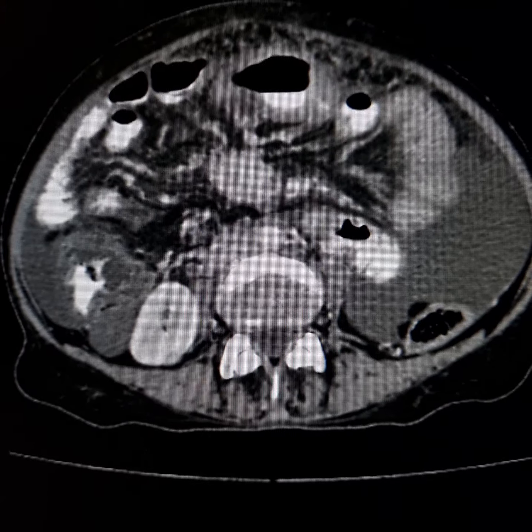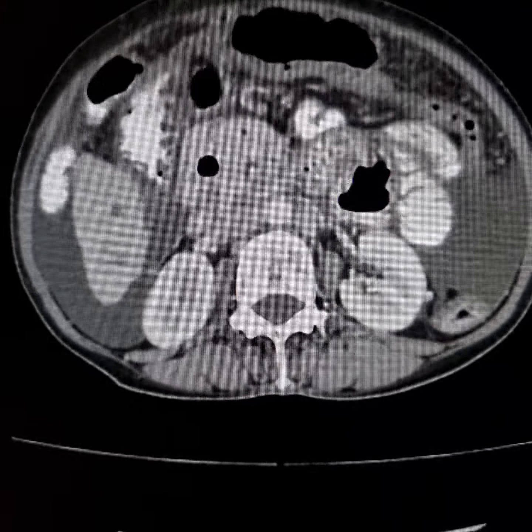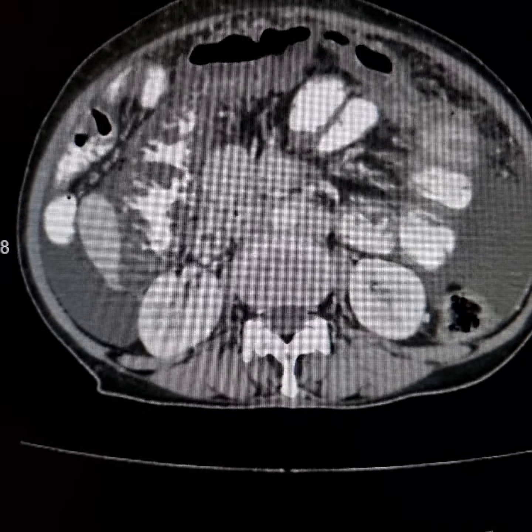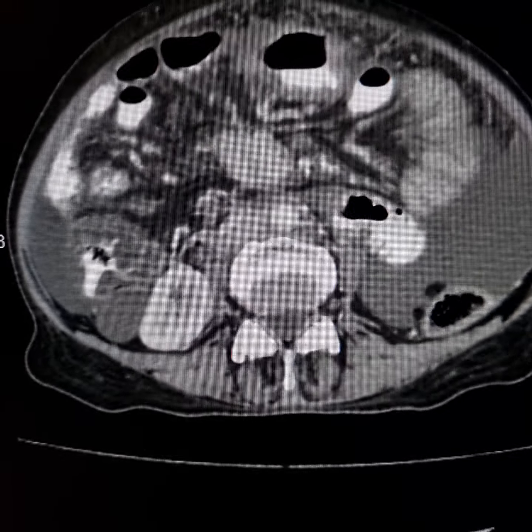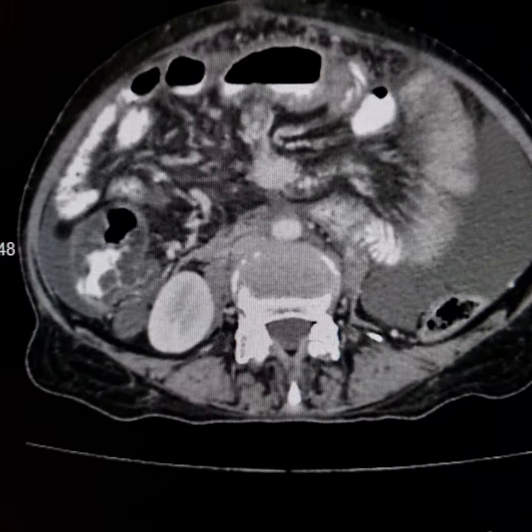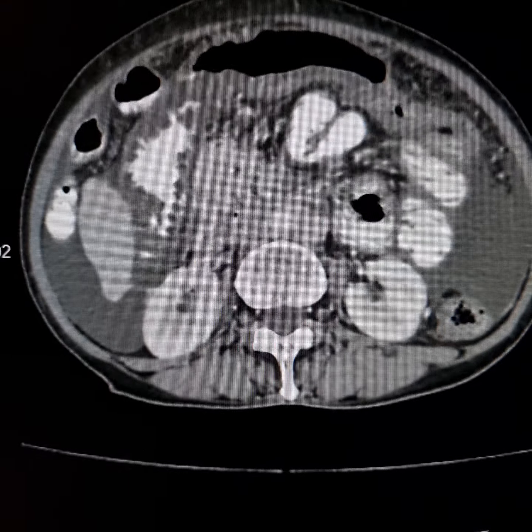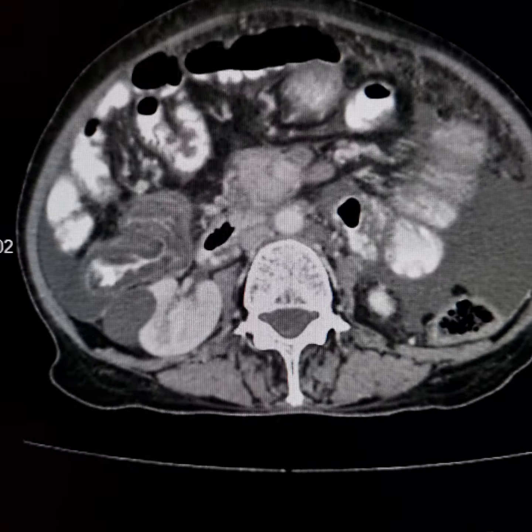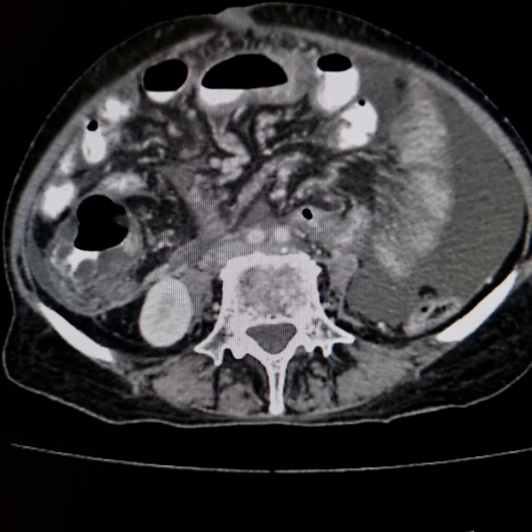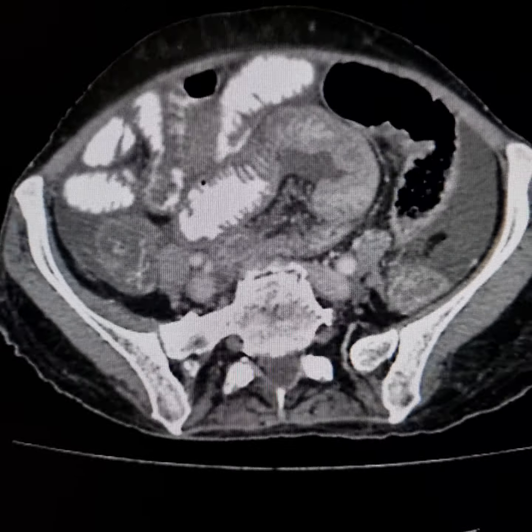and ascending colon. The advantages of the positive oral contrast medium are that we can assess the amount of peristalsis. Although dilated gut segments are present because of the gut ischemia, the contrast medium is passing through the small intestine, so this excludes intestinal obstruction.